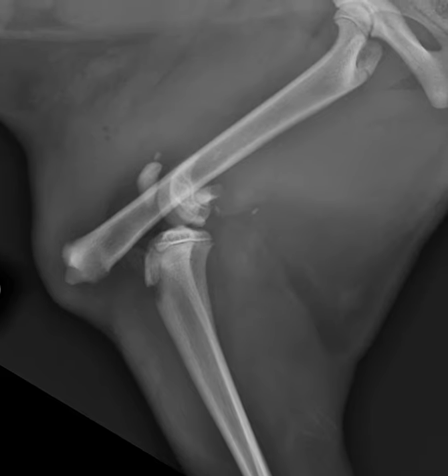So, to summarize my sentence for this fracture: in the right distal femoral physis, there is an open Salter-Harris 2 fracture with minimal comminution, severe overriding, and caudomedial displacement. There are 2 words that I used in my sentence that I didn't touch on yet. The first one is open fracture.